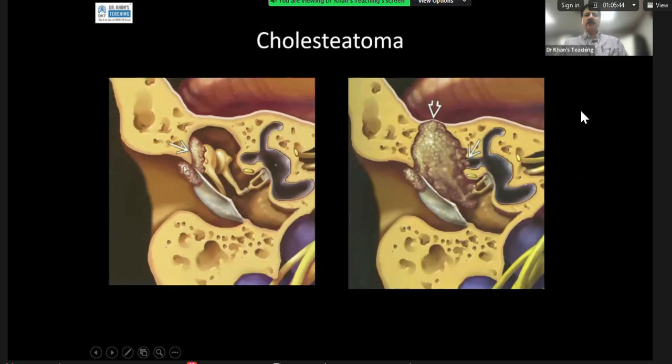see a pearly white type of appearance. And many a times the clinicians, they tell us that I can see a cholesteatoma. Please see what is happening inside. Tell me the roadmap, what to do when I'm going in, what to expect.